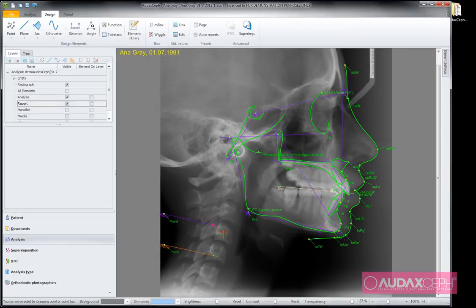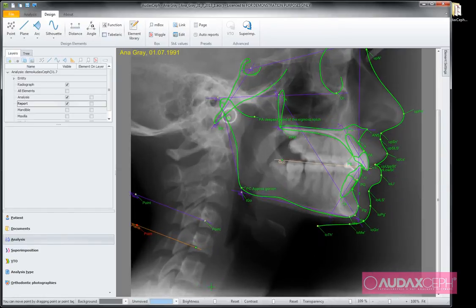But if I change the position of the point, because this plane should be parallel to the first one, it will always remain parallel, and it will go through the point that I selected it to go through. So I have here a mechanism which behaves according to my design intent.